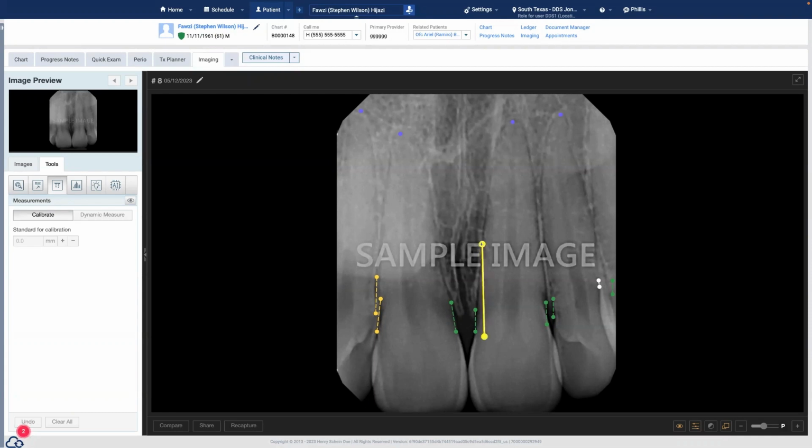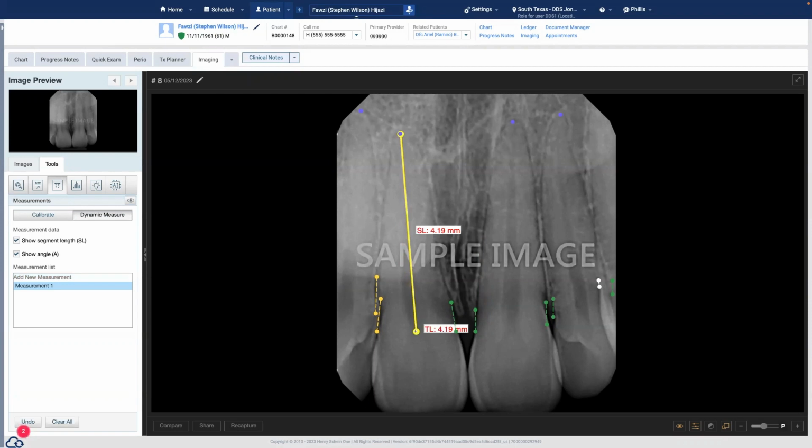So we'll calibrate it and say, okay, this is 2 millimeters or whatever. And once we've calibrated based on that probe, now to your point, we can measure from the apex and get feedback that your calibration was not accurate. So people are going to say that that's not 4 millimeters, but that's the idea. Obviously, I didn't have a probe in here to measure against. That's something you absolutely would want to do in order to calibrate your measurement. So there's nothing wrong with the measurement. It's just my calibration was inaccurate.